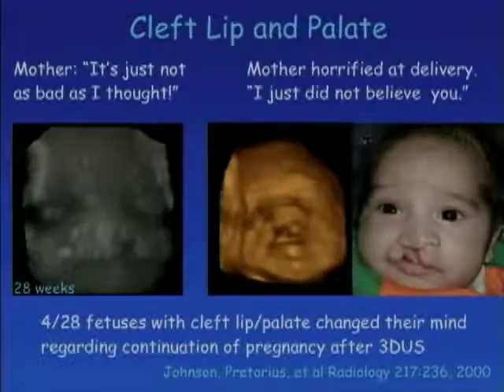And this mother, who had seen this picture that I showed you earlier, said she was absolutely horrified at delivery because she just didn't believe that there was a cleft lip on the baby, even though I showed her these incredible pictures. So in our first original series that we published in 2000, 4 of 28 fetuses with cleft lip and palate changed their mind regarding continuation of pregnancy after having a 3D ultrasound.